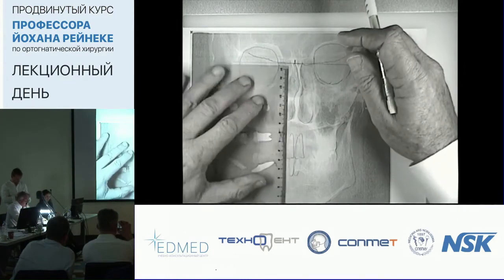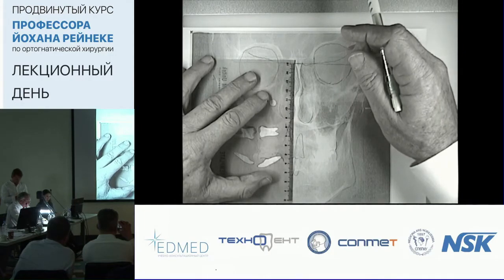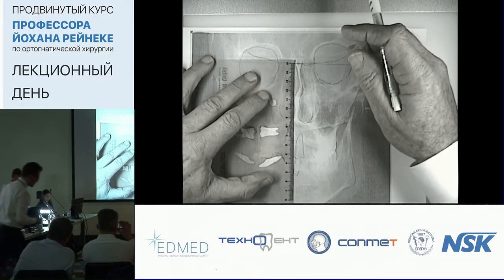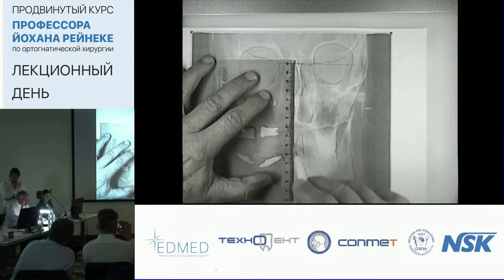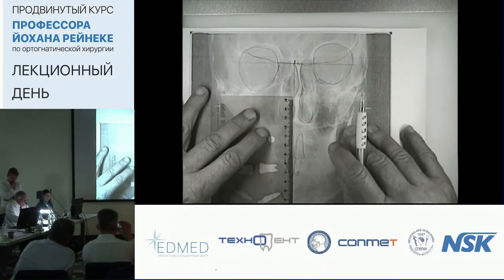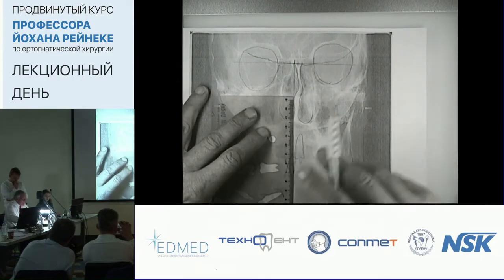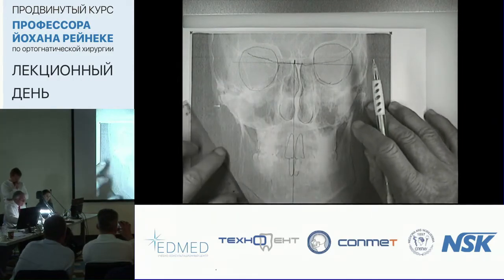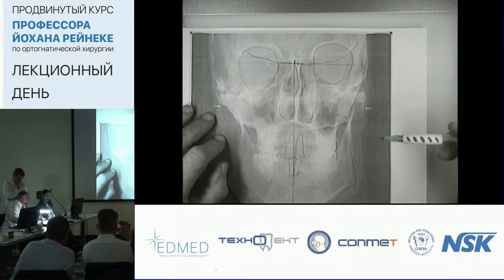I would then drop a vertical line perpendicular with the face. Perpendicular to that baseline. And now I want to look at where's the asymmetry. Is that the patient that we saw there? Yeah. Is that the one? Yes.